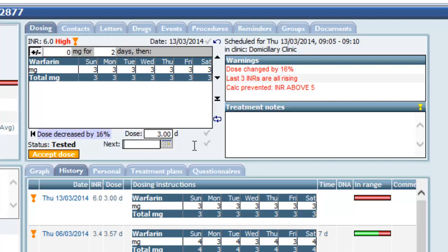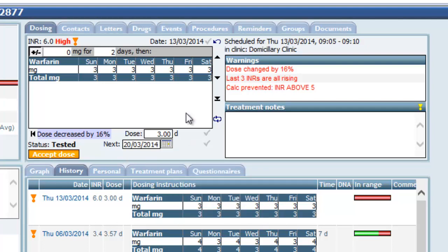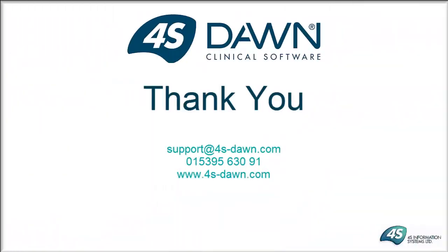Again, Dawn hasn't been able to suggest a next appointment date either. So let's pick a different day for them to come back. And then again though, once we've got our dose, we've got our next appointment date, the last thing remains for us to click on accept dose. And again, once we've done that, you can see today's record in history. At this point I might want to go to letters tab and print out a dose letter or a dose label, but this patient has now been dosed for today.